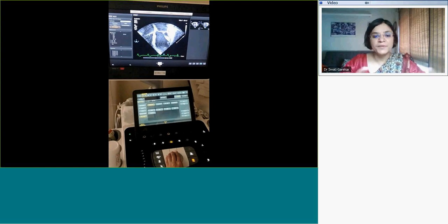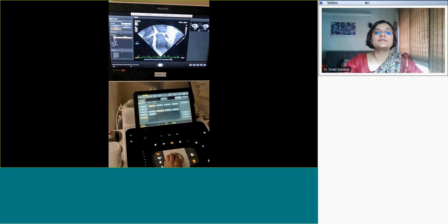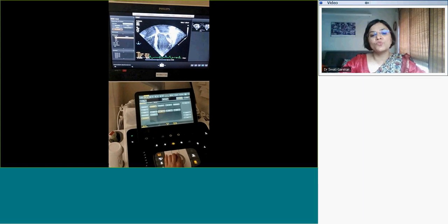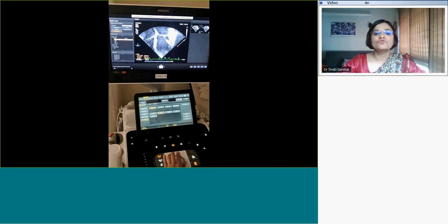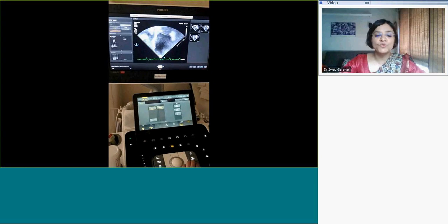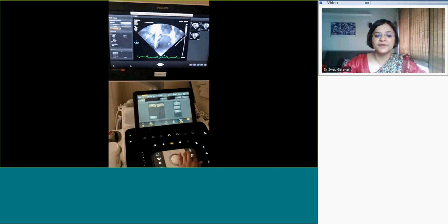You know all the steps there. Then go and get a 2-chamber view and repeat that, and it will give you a biplane ejection fraction. One very important number that it also gives out is the end-diastolic volume by biplane. Please get into the habit of evaluating end-diastolic volume. It's a much better marker of LV size compared to our LVIDd. So compare to adult values, and you can serially follow up with it. The next time you have a study with LVO, try looking at the Simpson biplane and the EDV that it generates. I have paused here.